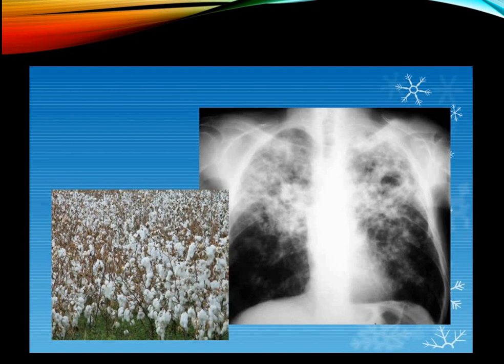And number three, the presence of cavitary lung lesions. If you look at the left upper lung zone, we have a rounded translucency which is caused by a cavity. So if we recap our thoughts, bronchopneumonia in the upper zones with cavitary lesions equals post primary TB bronchopneumonia.